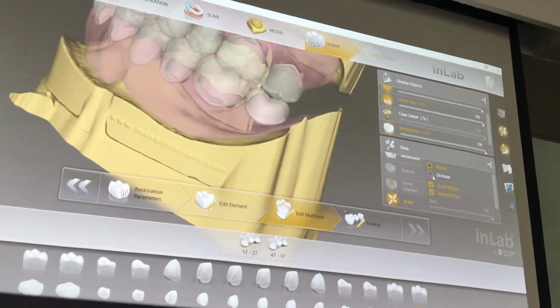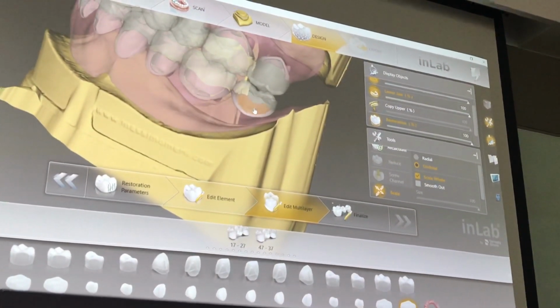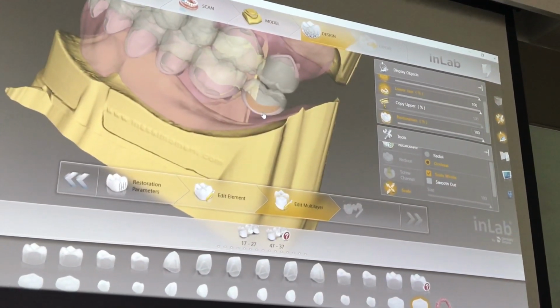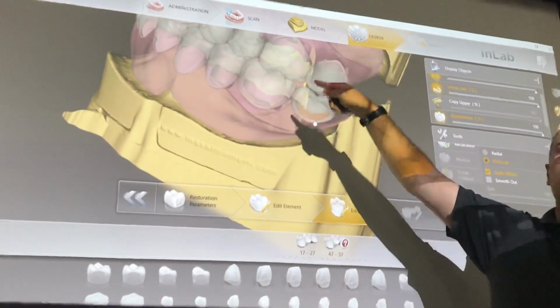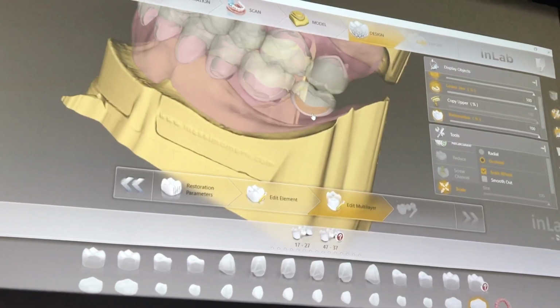Then I go occlusal, I remove the smooth out, and I go to that one, and what I do is I get rid of the prep, and I create a socket. So now when I mill out the veneering structure, that will be nice and solid, right? Yeah. And I mill it out as a bridge, and then I bond everything together. So now you've done a digital denture in a way, but using Inlab.